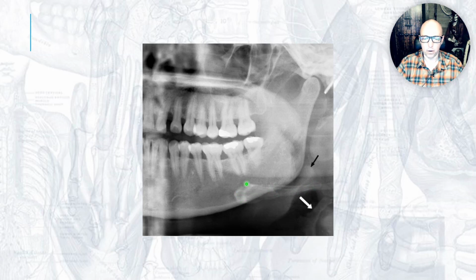Here's the body of the hyoid bone. And what projects over it and kind of curls up like this is the structure I was just talking about, which helps you swallow and breathe and not at the same time, that's your epiglottis. Kind of curling forward, which is common for it. It'll curve forward against the tongue. And so that space between the tongue and epiglottis we'll call the vallecula. That's an area known for catching fish bones. People go to the emergency room and doctors have to dig stuff out of there.